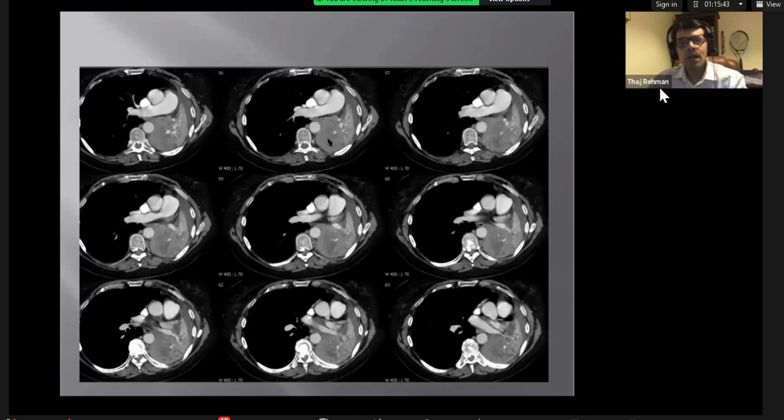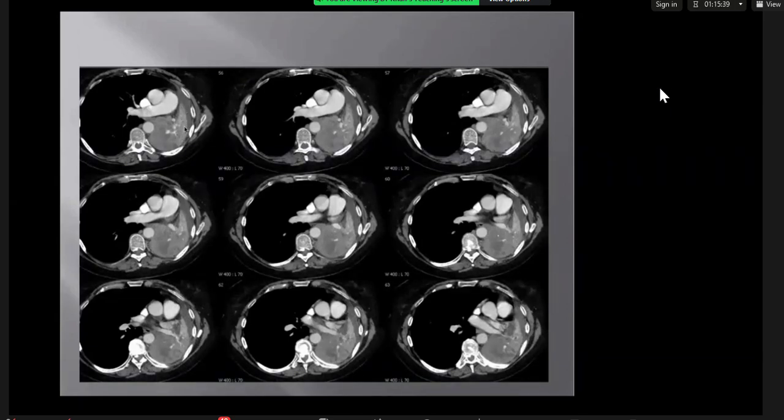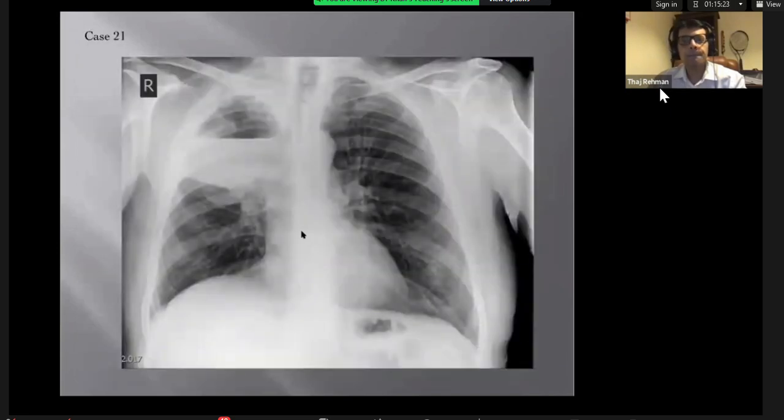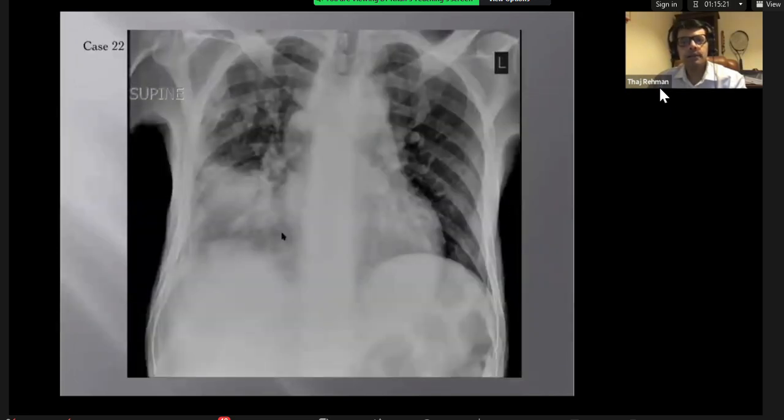The collapsed lung is always uniformly enhancing. Can you see that? So that's the collapsed lung, and the non-collapsed mass lesion. The mass lesion is actually a soft tissue mass, which is less enhancing on a post-contrast CT. It has got a lot of blood vessels and necrosis going on. We'll skip this and go to this.